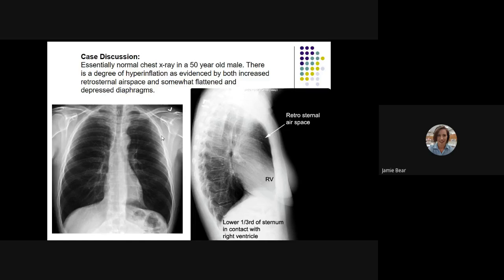So what I was just asking was, if you're looking at this, you see a patient whose lungs are pretty radiolucent, meaning lots of air, and they just look like big lungs. I asked what pathologies or conditions you could think about. When you hear air trapping and larger radiolucent lungs, you're thinking of an obstructive disorder, so you're thinking of COPD. This could be an asthma exacerbation. You don't know, it definitely could be. But we know there's some sort of obstructive component.